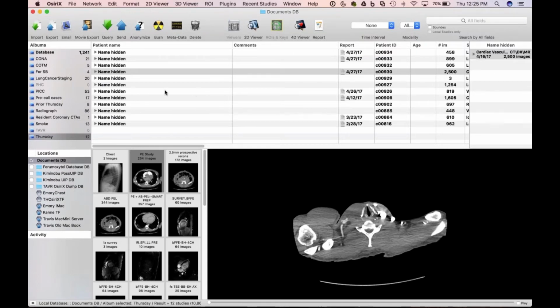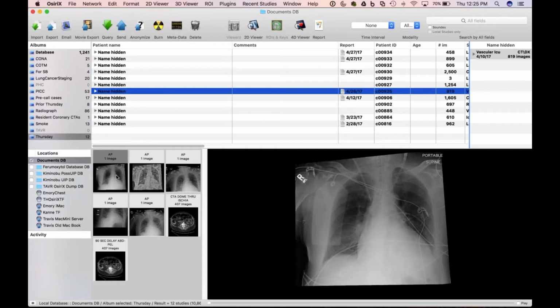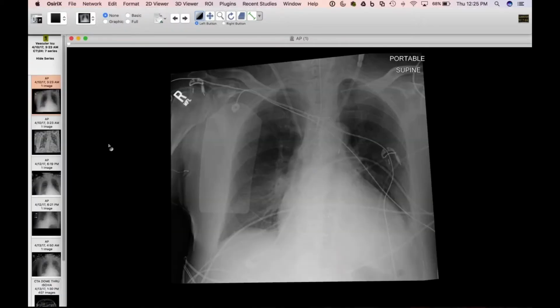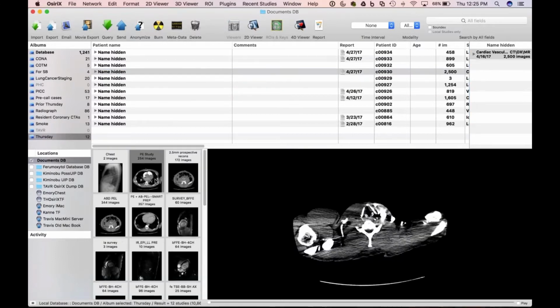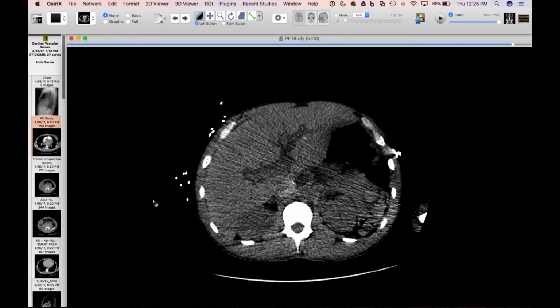Now, I'm going to show one more here, and then I can hand off since we've got a lot of people on here. But that leads me to this one. Along that, your mention of the timing. We've been timing our PE studies off the left atrium for 5 or 6 years, and it's very unusual to get a non-diagnostic study. I've been met with resistance when I mention that. It works quite well because there's contrast still coming in, and there's contrast on the left side of the heart and in the aorta, so you get a free look at the aorta too.